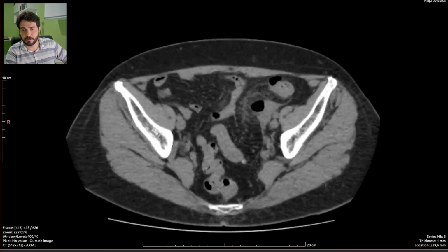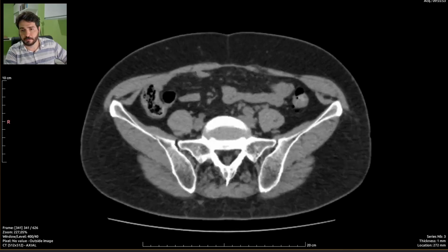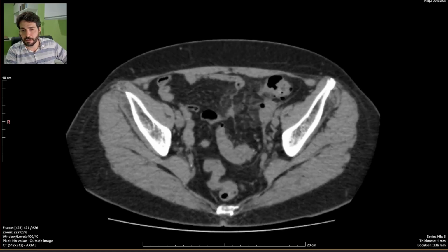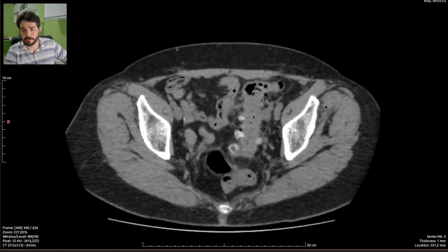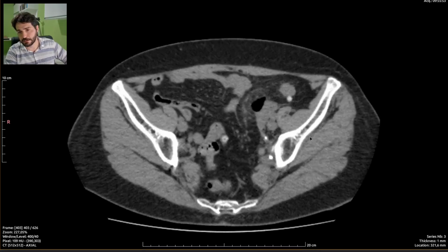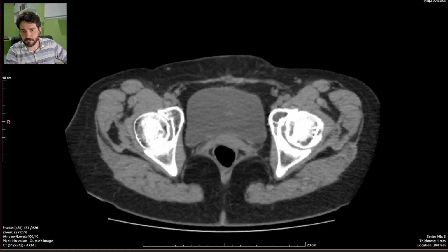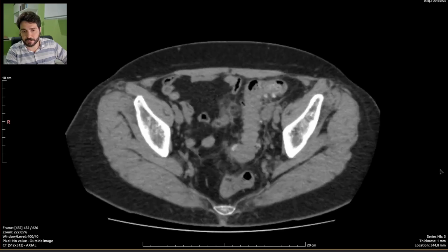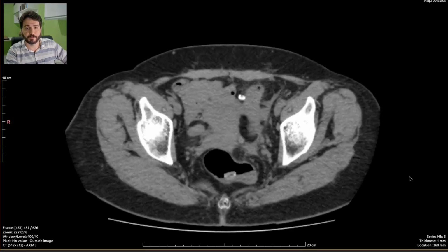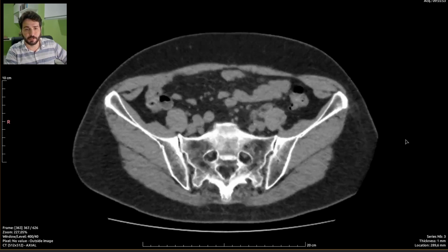Also bowel and colon, right colon, transverse colon, left descending colon, and sigmoid colon is diseased, is sick. This is the cause of the patient's symptoms. This is the left iliac fossa, and this is hypogastrium because it is deep pelvic cavity. So, as you see here, this is a classic presentation of a complicated acute diverticulitis of the sigmoid colon.